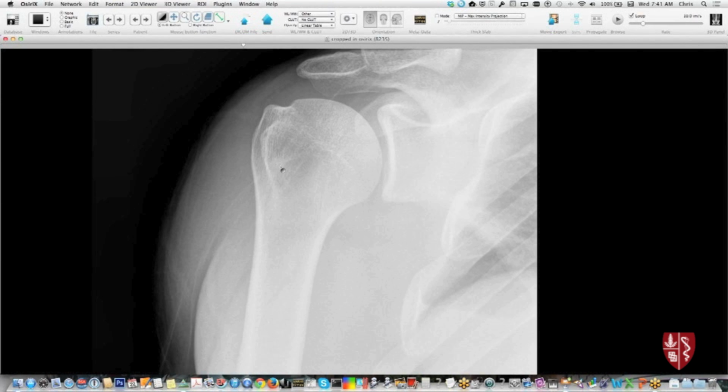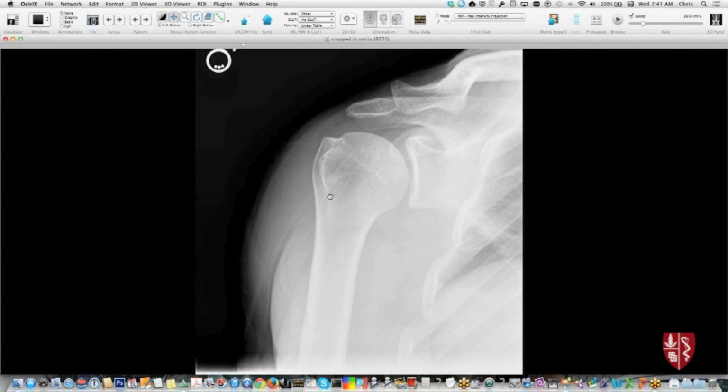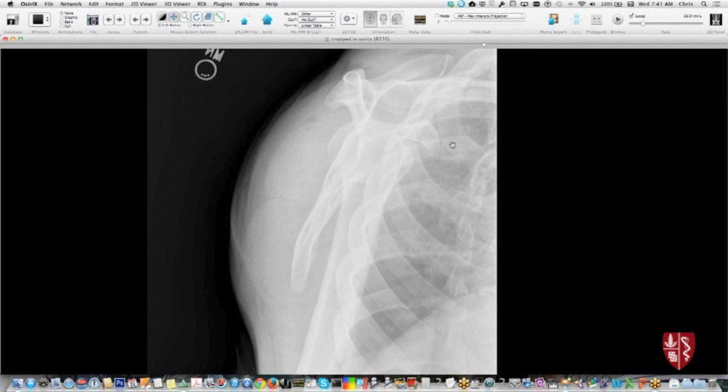So if we look at some radiographs now, normal to start out, and I'll try to go fairly quickly through these cases because I have quite a few, but so here's what we would probably call a Grashey view, because we're looking down the glenohumeral joint. The humeral head is in external rotation because you see the greater tuberosity here and the lesser tuberosity here, AC joint here, and here's the coracoid process projecting out. Here's a Y-type view where you see scapular spine, coracoid coming out here, scapular body, and the humeral head centered over it.